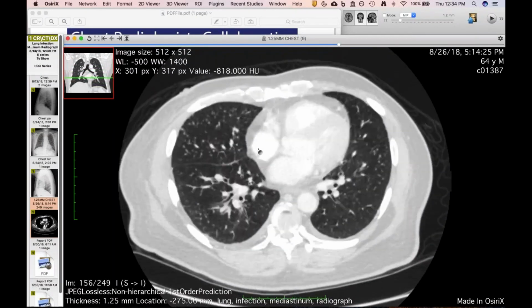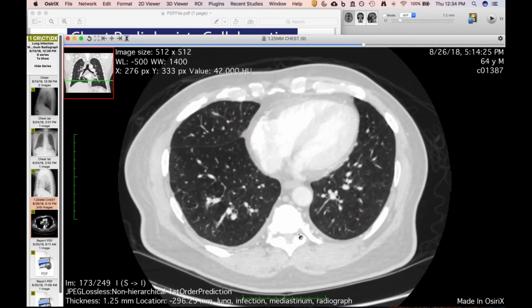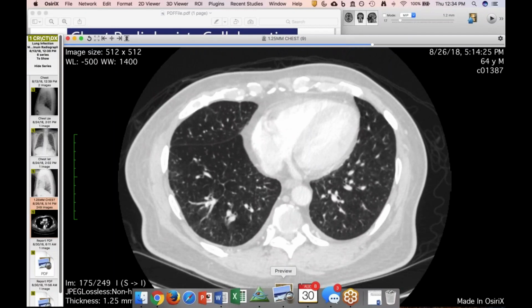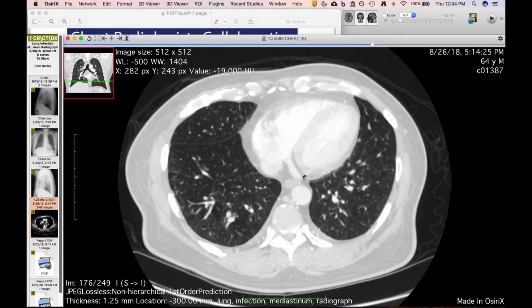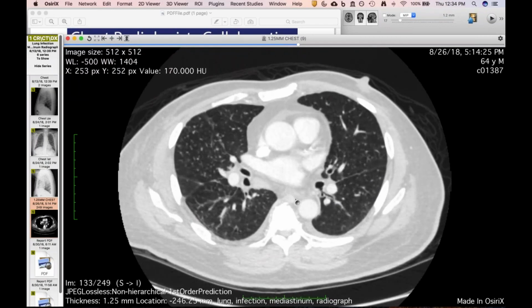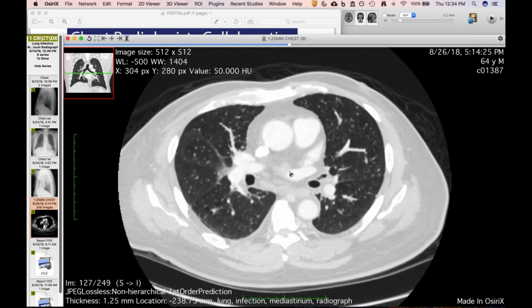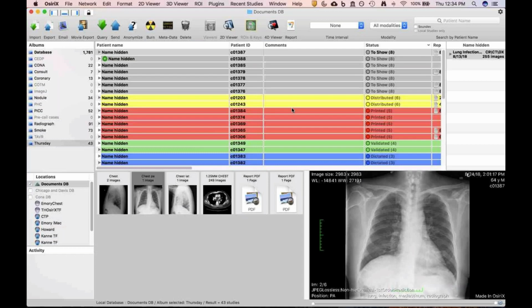I guess so. Yeah, I wasn't surprised that the FNA of that lymph node was positive. I was surprised by this though, by the sputum. So we've seen now in the last week, we've seen probably last month, we've seen 4 or 5 cases of TB. This is the first miliary one, but we've seen several active airways TB. Jeez. All right, let me show one more here.